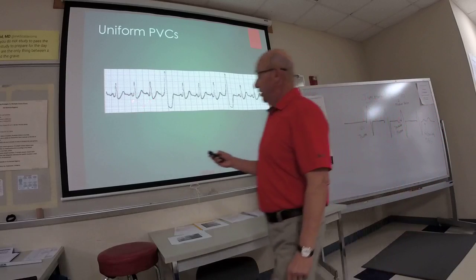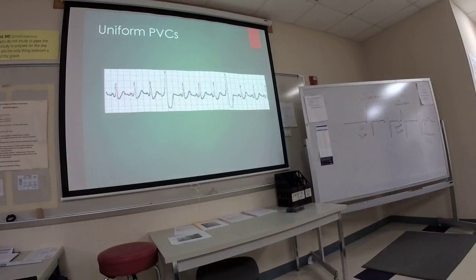Okay? So if you notice, these PVCs happen every 3rd beat. So it's regular. Every 3rd beat you have a PVC, so that's pretty regular. It's unifocal because it looks the same. Okay? Make sense? Unifocal, so it looks the same. Multifocal, this PVC would look different than this PVC. It just means that it's firing from a different foci in the ventricle.